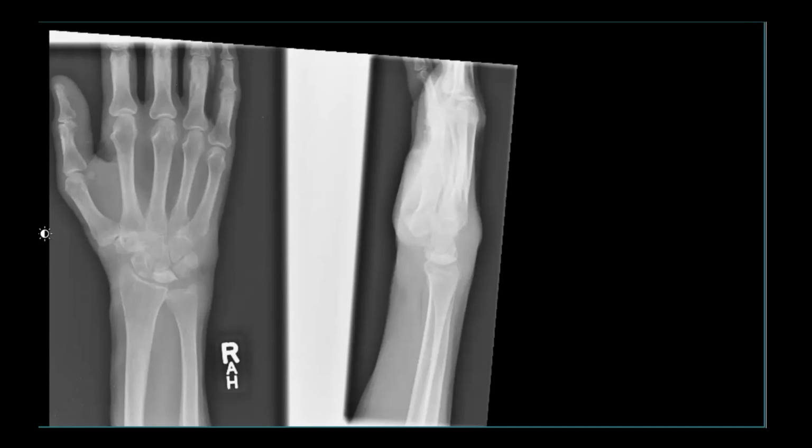So moving on to the lateral view. Now, considering that I've seen a triangular appearance of the lunate, there is also some increased sclerosis involving the lunate bone. So the two differentials that I'm thinking of is either Kienbock's disease involving the lunate, but I will also review the lateral to ensure there is no dislocation, lunate or perilunate dislocation, because the lunate appears slightly triangular in shape.